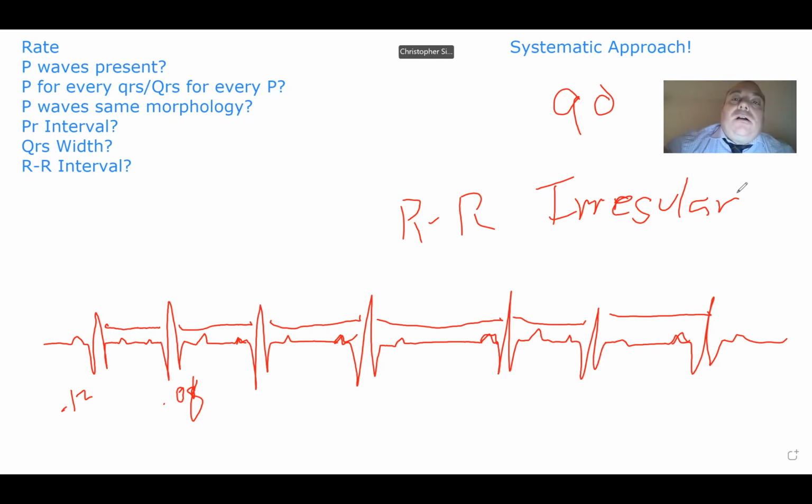Okay, so let's talk about, let's see, what we want to do. Let's talk about your atrial rhythms now.